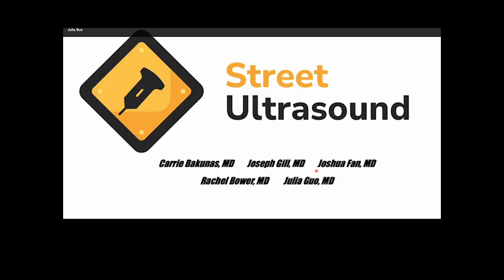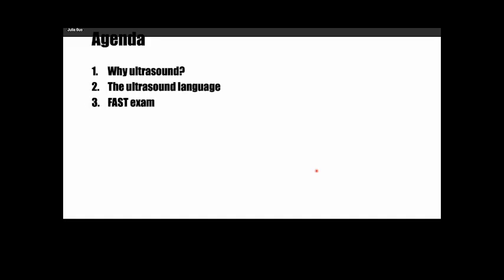So let's get started. Today we are going to talk about why we want to use ultrasound in the pre-hospital setting and the basic ultrasound language, the FAST exam, lung ultrasound, as well as cardiac and inferior vena cava.